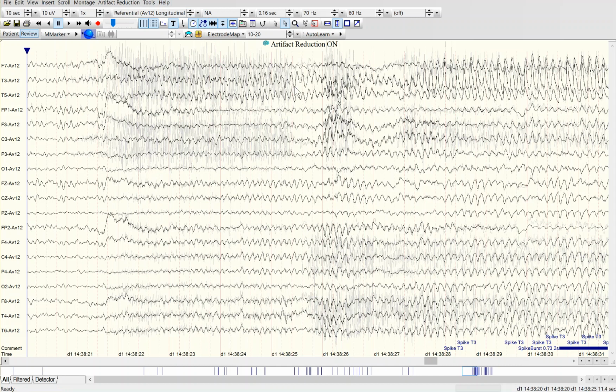And I want to look at the coherence over a specified period of time, because as the seizure evolves, the frequencies change. In this case, this one's evolving from faster to slower. So I want to pick something that's fairly stationary towards the onset of the seizure for this particular one.